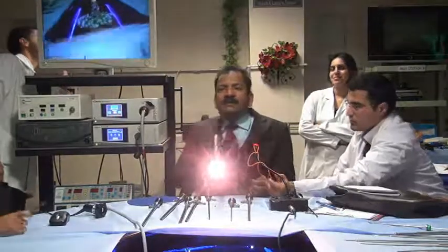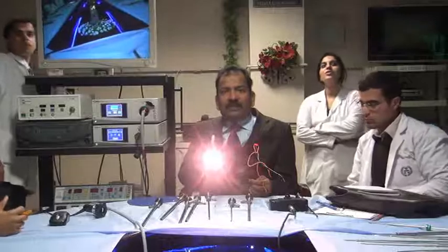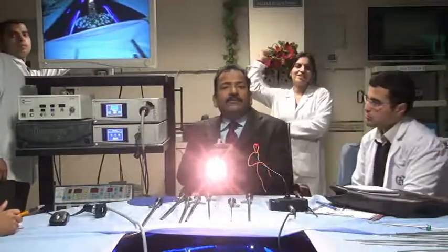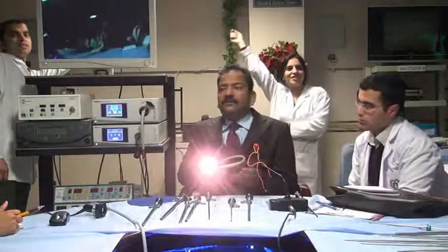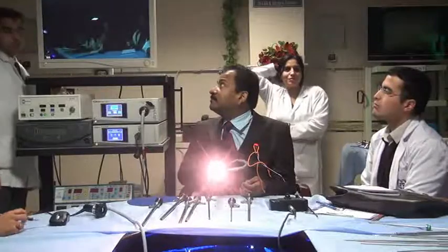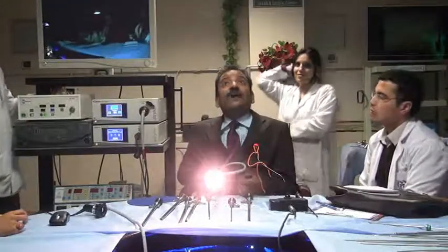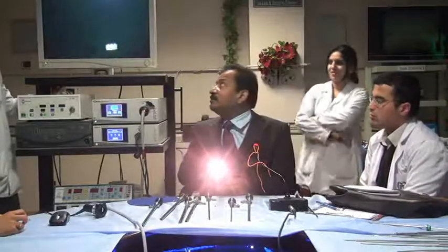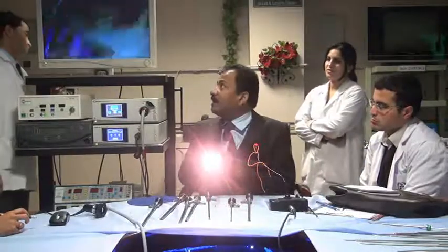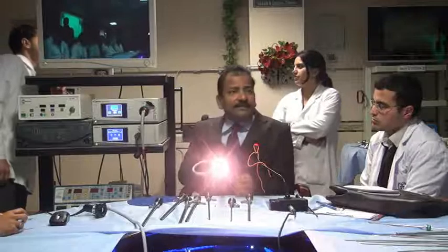If the surgeon says I want to see right, just like I want to see you, I will turn it to the left. Now I can see you, although the light is less. If I have to see up, I will go down. I can see the ceiling light. If you have to see left, I will move it right.